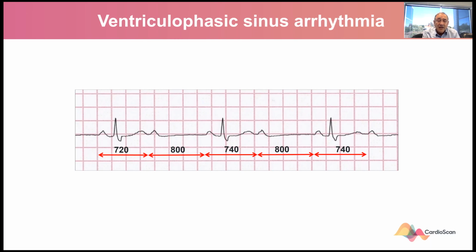sequence of P, QRS, and the next P wave, that cardiac output is much larger than, of course, the one which does not have a QRS, where there's no beat. And what happens then is that the P to P interval lengthens to 800 milliseconds, because it looks at the embedded one and says, okay, the output is satisfactory, I'll slow down.